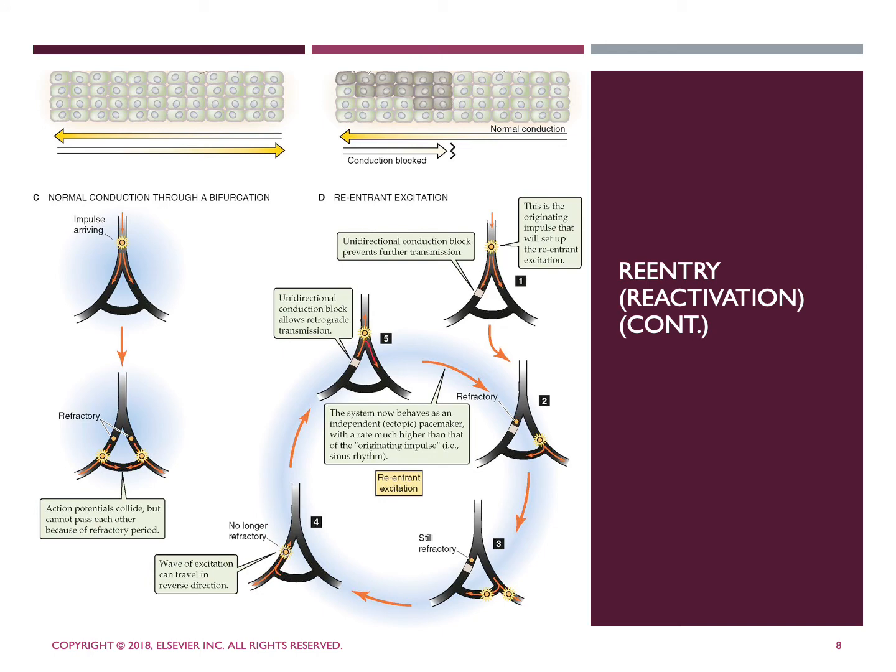Normally our impulse is going to spread through the heart only once after it's initiated by the pacemaker cells. Typically our pacemaker cell initiates that impulse, and it travels through the conduction system normally. On our ECG, we see a normal heartbeat: our P wave, our QRS complex, followed by our T wave.